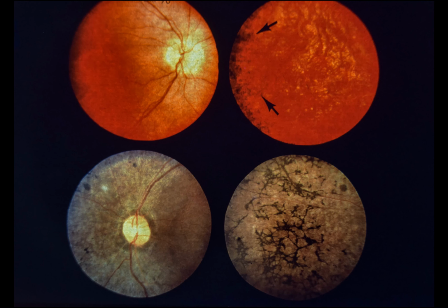Slide 90. Pigmentary retinopathy. Diffuse abnormalities in the retina and retinal pigment epithelium occur in a variety of neurological conditions. Upper left and upper right. This 1 1/2-year-old male was noted to have nystagmus since birth. He was otherwise healthy. He followed light with either eye, but would not follow small objects. His pupils reacted sluggishly to light, and a horizontal nystagmus was present in all positions of gaze.